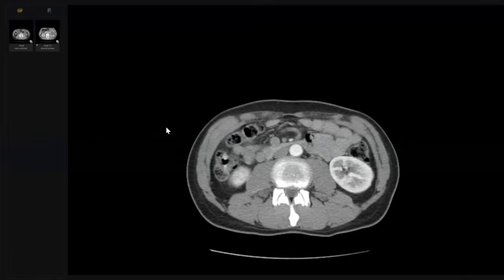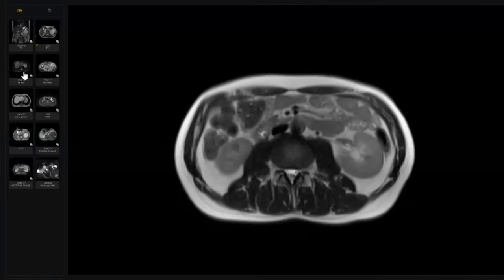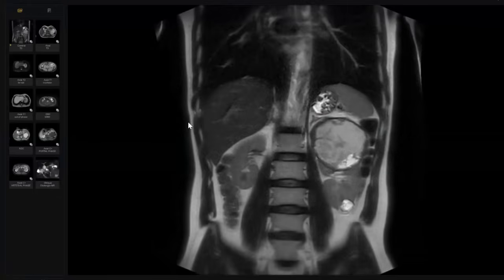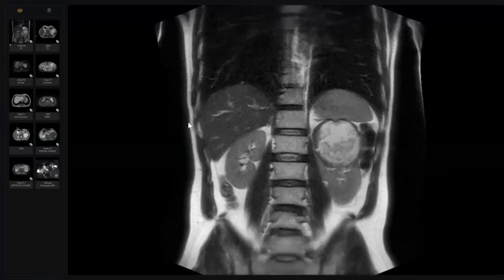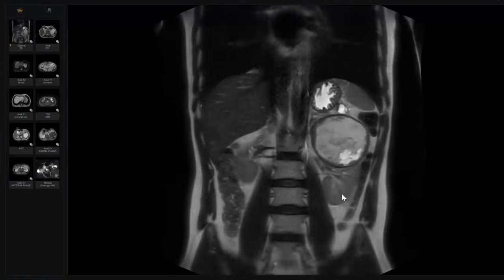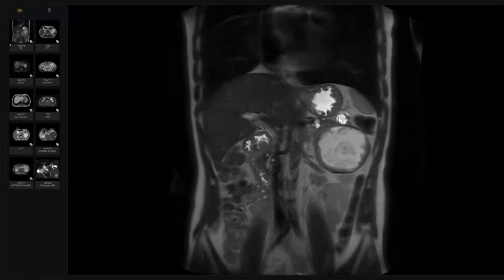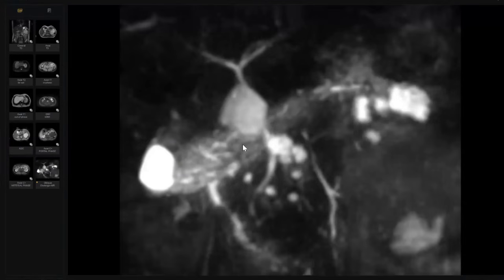However, if you pick up two findings, like the pancreatic cyst and the RCC, and you ask for MRI, it is acceptable. What does the MRI mean? Look here, and this is what I gave at the beginning. Besides this lesion, there is another lesion here. And what else? Look here at the pancreas. Look, one, two, three, four. At least you must ask the examiner for the 3D volume rendering. Why?